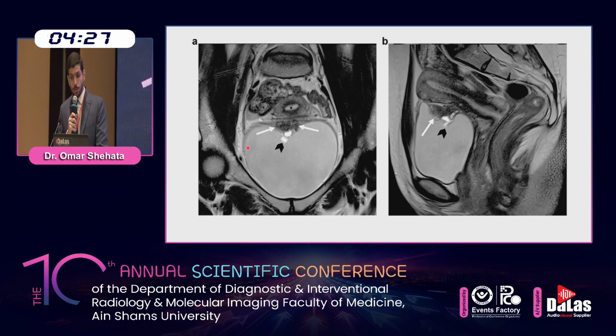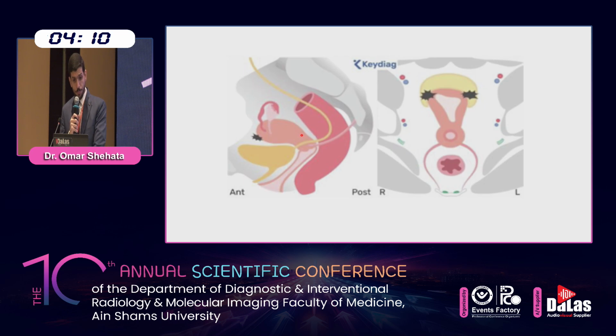a patient presented with bladder endometriosis with dysuria. Coronal and sagittal T2 images reveal a well-defined low signal intensity nodule in the bladder projecting into the lumen. The nodule exhibits heterogeneous content due to small cystic areas indicative of glandular component.